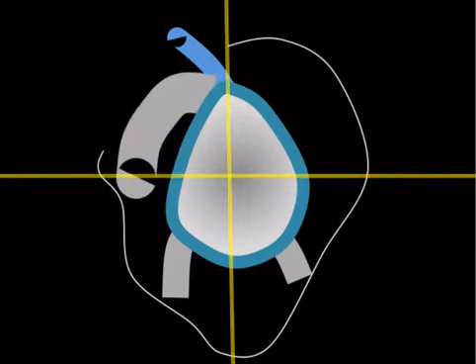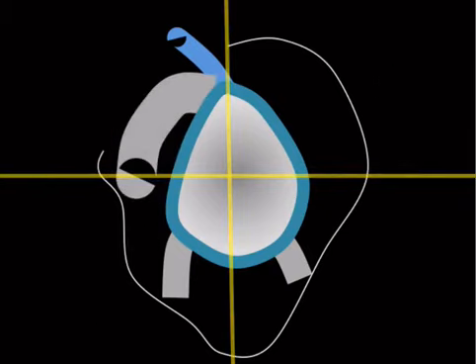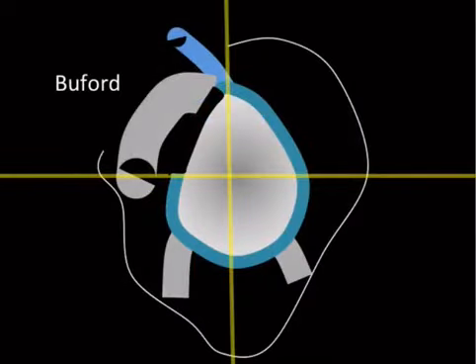So when you've got a normal variant, this is the middle glenohumeral ligament. This is the biceps tendon here. These are your inferior glenohumeral ligaments. So when the middle one, instead of attaching here, attaches all the way up there, and you are missing a part of the labrum, that anterior superior labrum, that's what's called a Buford complex. Who cares? It matters only that you don't call it abnormal, so that they try to fix this, quote unquote.